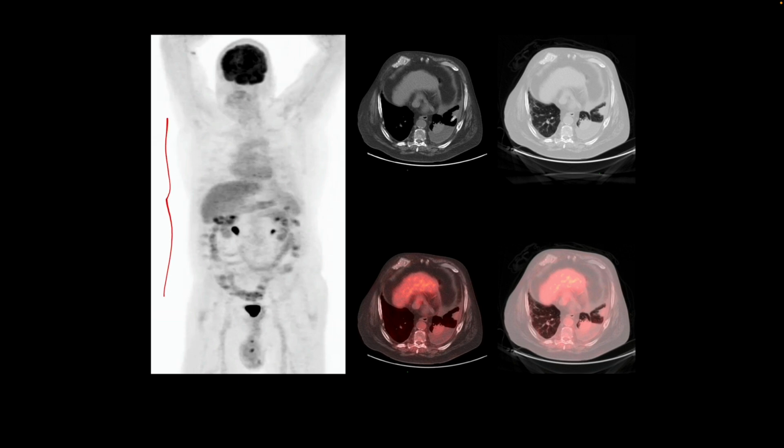And the cross-sectional images are showing this part in the left lower lobe of the lung, where we see classic appearance of rounded atelectasis. This is in the lung windows. We find that there's a part of the lung that appears rounded, atelectatic, and we find that the vessels and the airways are supplying this part of the lung, and we see that there is faint FDG uptake, which is physiologic. There is no focal hypermetabolism there, and so a tumor or a lung cancer has been ruled out.